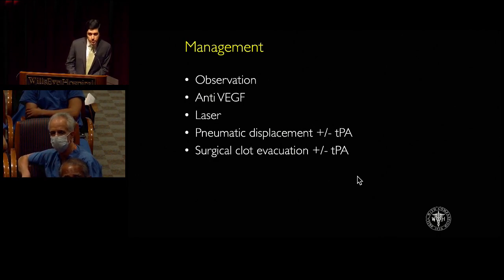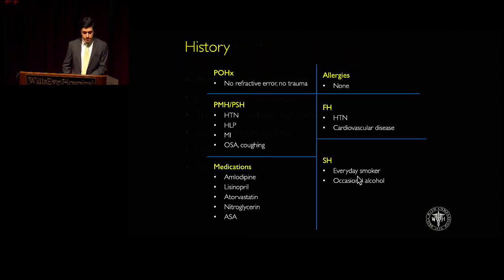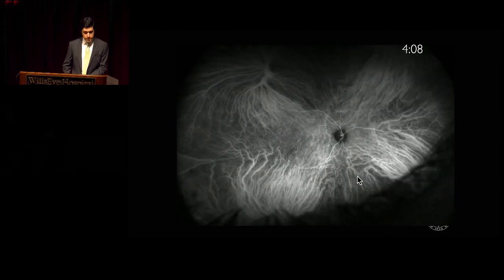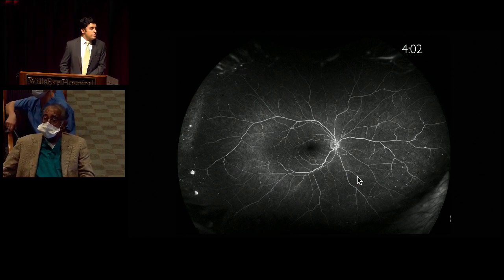So this patient was indeed sent to their PCP after their first diagnosis and was placed on an additional antihypertensive medication. Jose, the microaneurysms peripherally, go back to the fluoresceins, those all go along with hypertensive retinopathy, I presume, right, Jose? Yeah, I was wondering about that. I think so, but maybe it would be worthwhile listening to the carotids too.